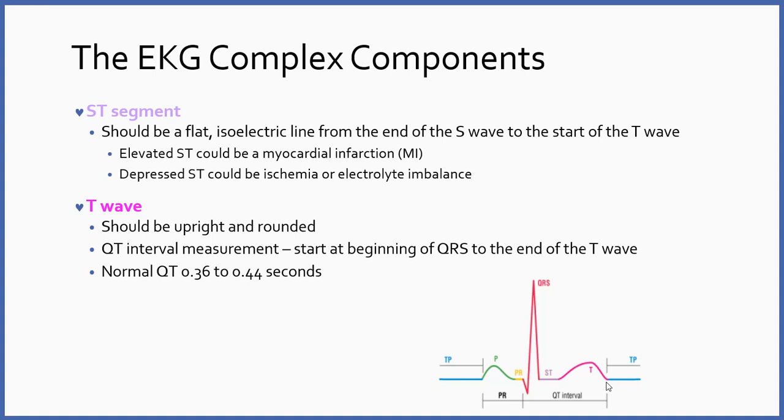And the reason for that is that during early repolarization, if any irritable foci in the ventricle fired off, it won't change things. But the back part of the T wave, from the slope down here, we've almost got things put back together where they belong, but not quite.